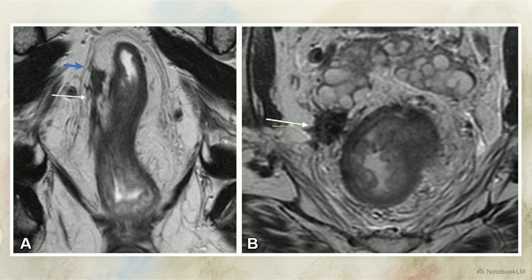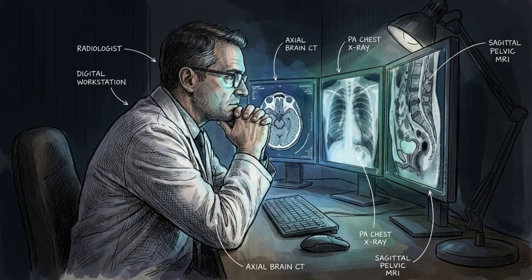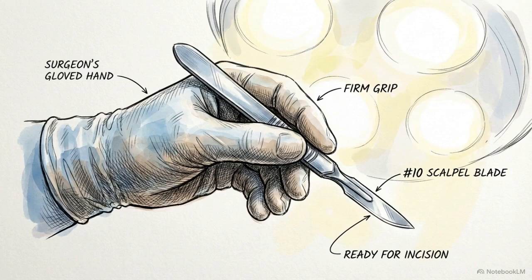If these primary extensions sit within 1 millimeter of the fascia, the MRF is involved. Here, a heterogeneous spiculated nodule, a jagged tumor deposit, sits less than a millimeter from the boundary, constituting MRF involvement. However, a smooth, completely encapsulated mesorectal lymph node, even if malignant, does not constitute MRF involvement. Radiologists must report on the immutable anatomical reality of the MRF. They should not attempt to guess the surgeon's dynamic CRM. The operative team requires the absolute anatomical truth before making their first cut.